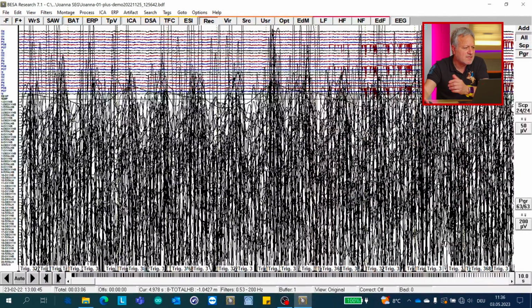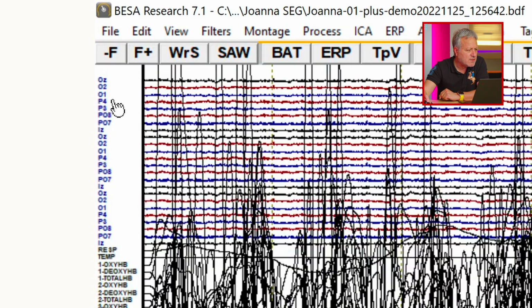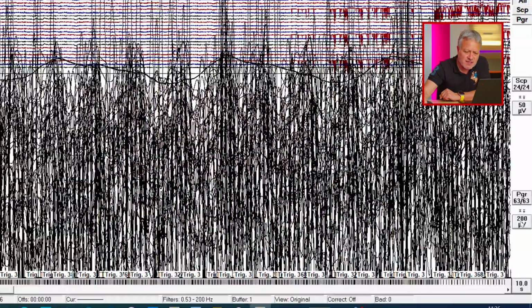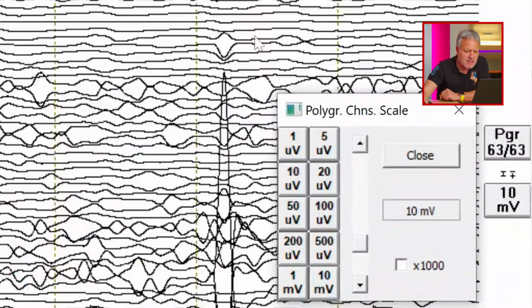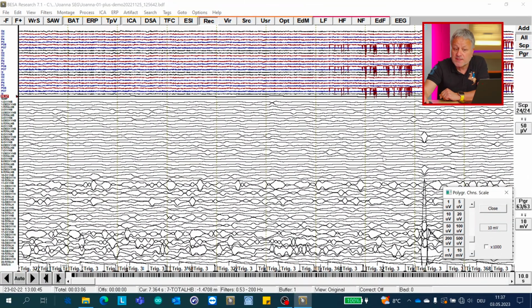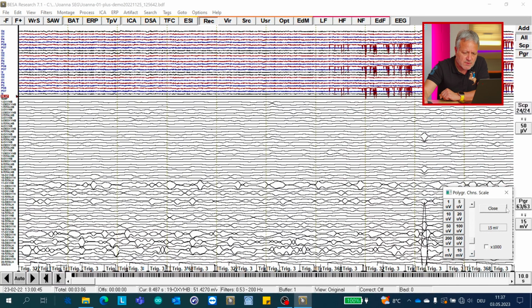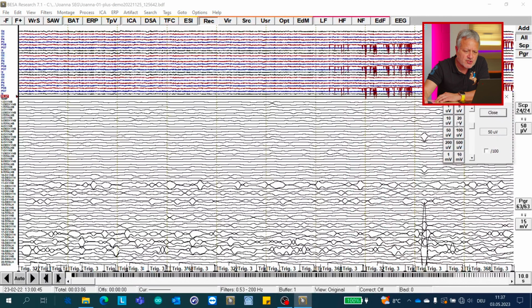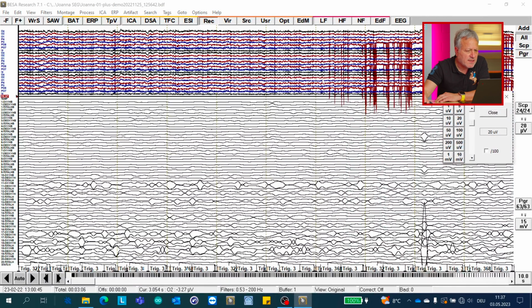Very, very interesting. So we have the scalp channels, OZ to IZ. In fact, we've also recorded respiratory. This is really nice. Let's just quickly change the display gain for the NIRS. Let's move that to around 15 millivolts. That's okay. And let's just open up the actual EEG, so there are your artifacts, etc.